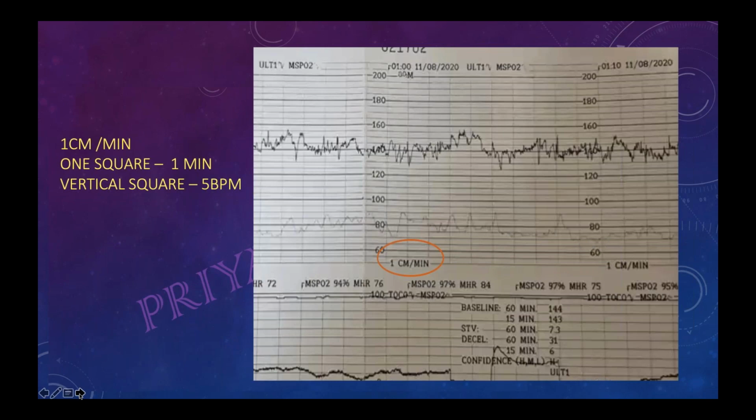Okay, thank you very much. Can I interrupt? It is also written there, maternal heart rate 84/75. A few days back I saw a CTG from some college in the UK. They had the maternal pulse like this. Some hospitals take the traces also.